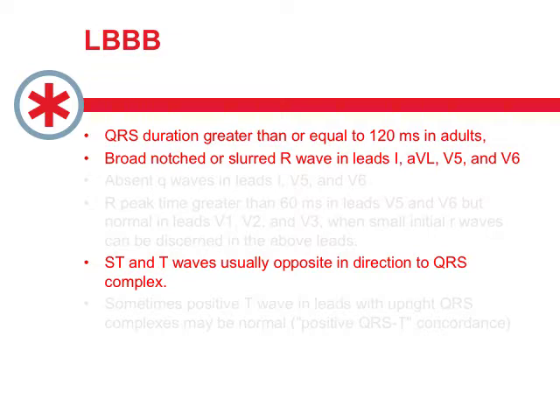So first of all, the QRS has to be wide in a left bundle branch block. Because the right ventricle fires normally and then the left ventricle is activated from the right, it's going to take more time to occur. It doesn't occur along the normal electrical system. And so you're going to have a wide QRS that really represents that extra time.